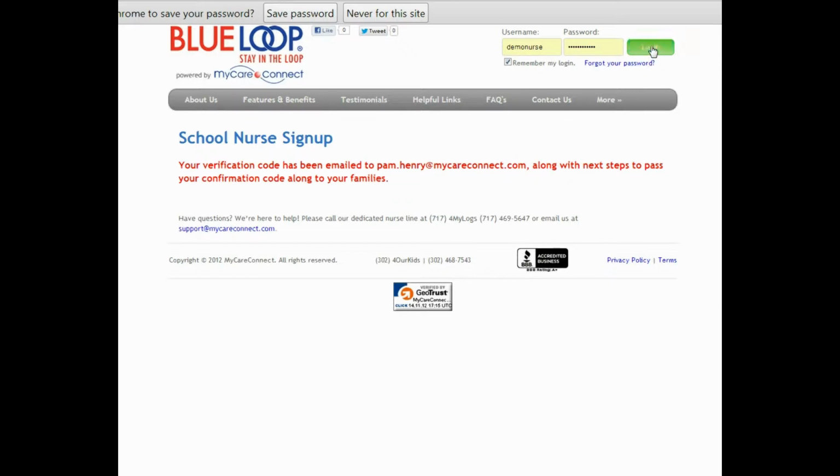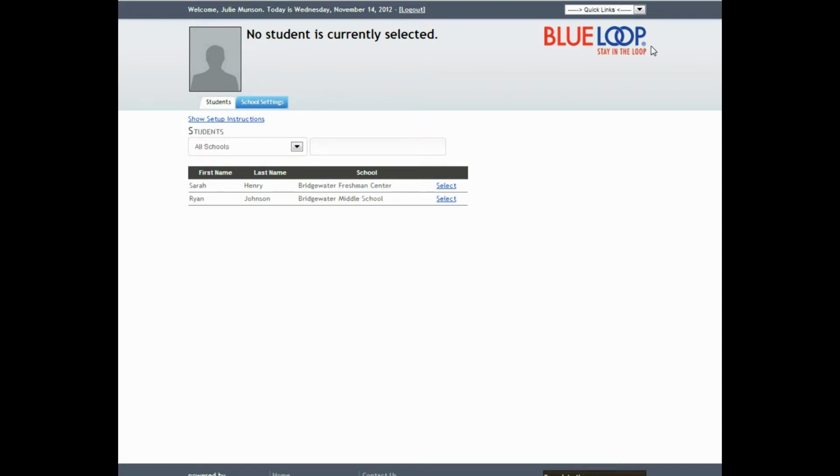So now I'm going to go ahead and log in as a different nurse just to show you how an already established nurse would work with her system. So at the very top, you're able to see that you are logged in, and in this case, the nurse is Julie Munson.